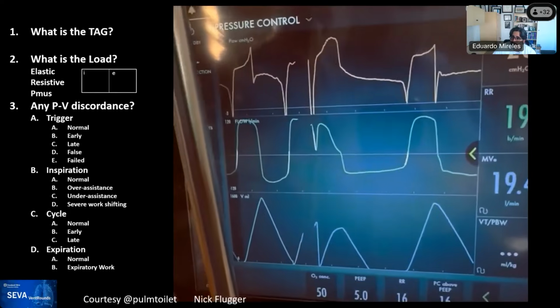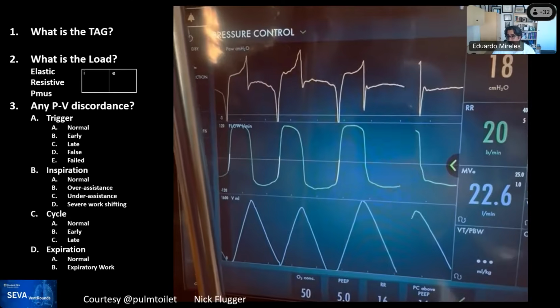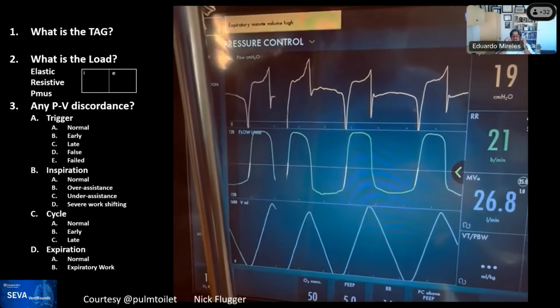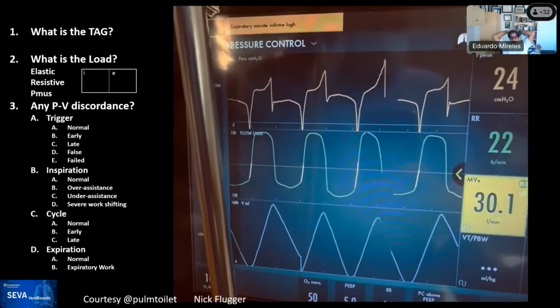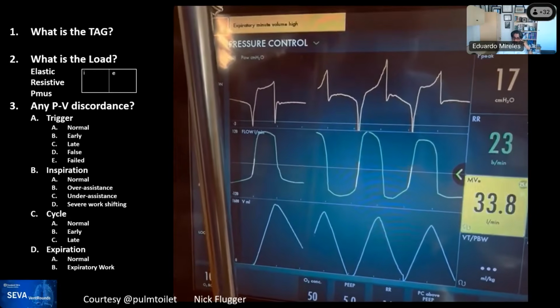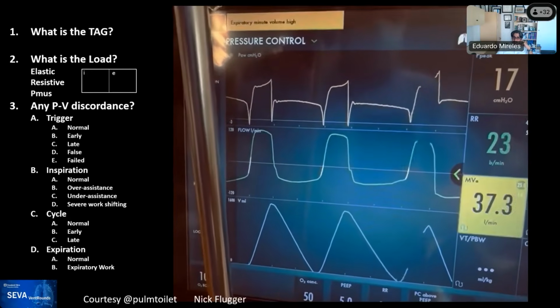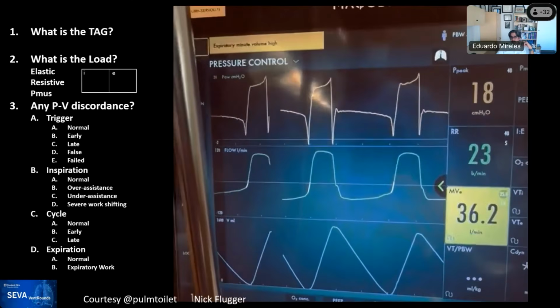I don't know. Heart failure in this case, ejection fraction of 10%. We know that the presence of Cheyne Stokes ventilation in patients with heart failure is a poor prognostic factor, just because it's a manifestation of how poor the ejection fraction and the circulation are, and the respiratory controllers.